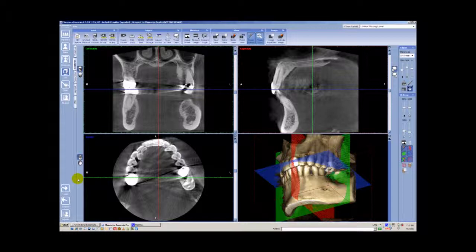Currently, we have a volume open in the default Explorer view, and we need to discuss how we can manipulate it to look and view this image data. Everything is basically controlled by your mouse functions. There's three main mouse functions. You have a left mouse click, you have a right mouse click, and then you have a center scroll wheel.